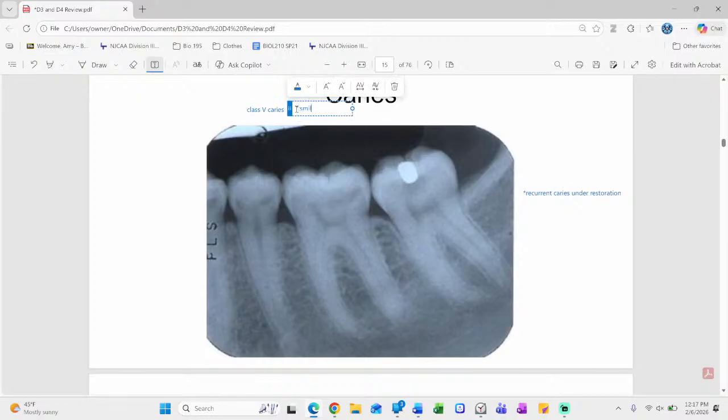External oblique, internal oblique running through there. Computer did that. Periapical, little wide, but is that something to be concerned of, you think? Don't know. Might have to test the tooth. Might have to see how far these caries go when you remove the caries.